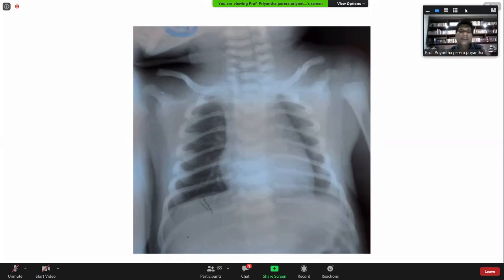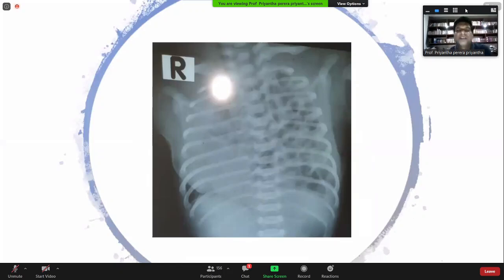A large baby comes and gets stuck, the head comes out, but the shoulders won't come out. And when you pull it hard, you get a fracture of the shoulders, right? Right. So these are the newborn babies who were depressed at birth, had to be ventilated, had to have bag and mask ventilation for resuscitation. And the child was having respiratory distress from birth. What is the diagnosis?